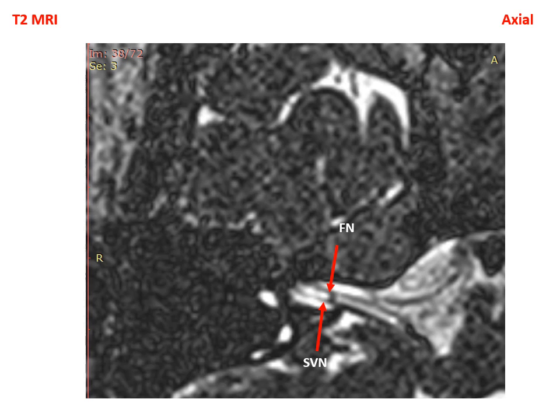Remember always that the facial nerve is anterior and superior. Seven up. Remember, seven up. So the facial nerve comes before the cochlear nerve. And as we mentioned, the vestibular system is up and the cochlea is down, so the cochlea will come later on. The facial nerve is anterior, the superior vestibular nerve is posterior.